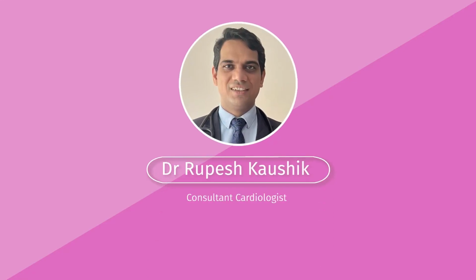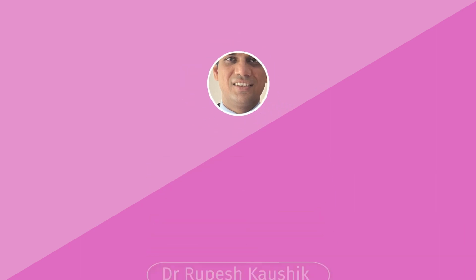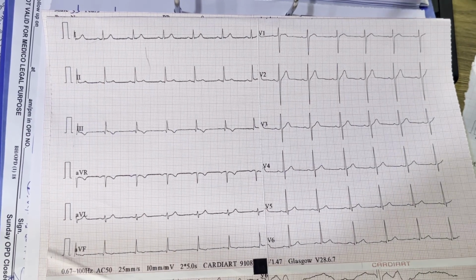Very good morning. This is Dr. Rupesh Kaushik, cardiologist, and I'll be talking about conduction abnormalities today. I'll show you a clinical case. This is first to demonstrate how a normal ECG or normal conduction looks like.